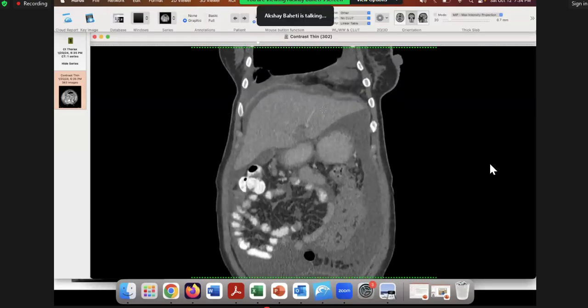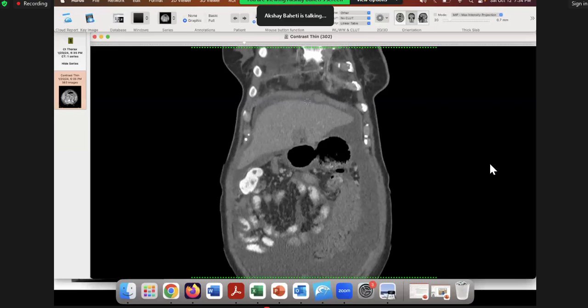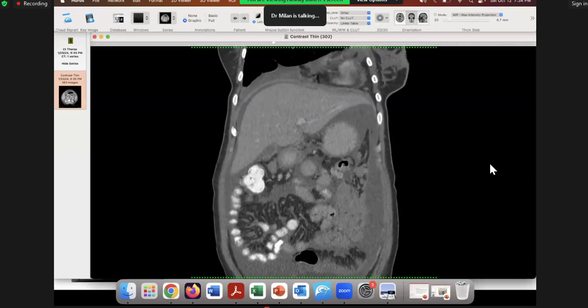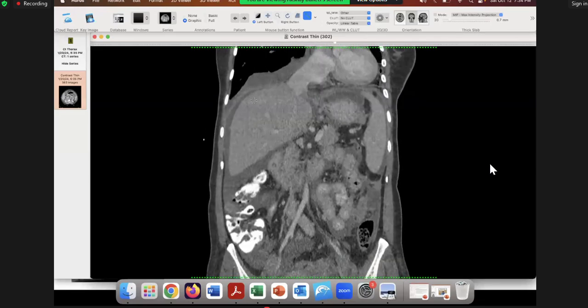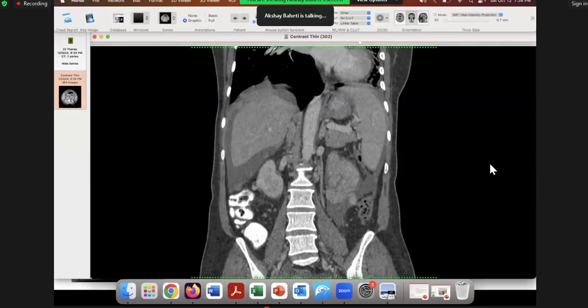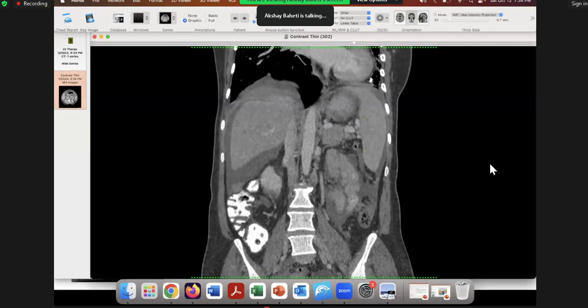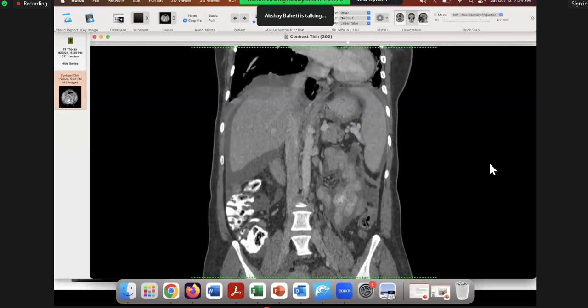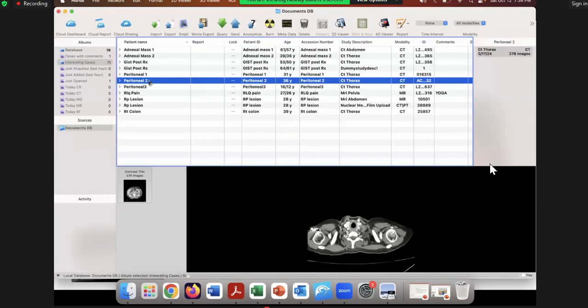So I had said I'll sort of show you. So you can see this is a subdiaphragmatic deposit here. Clearly, it's not a surface liver deposit, it's a subdiaphragmatic deposit. So coronal helps you in sort of figuring those things out. And here again, sort of you see this deposit here. And that again is probably involving that. So I think it's subdiaphragmatic and of course indenting the liver surface also. That's the first case. And what I have is 2 sort of companion cases.